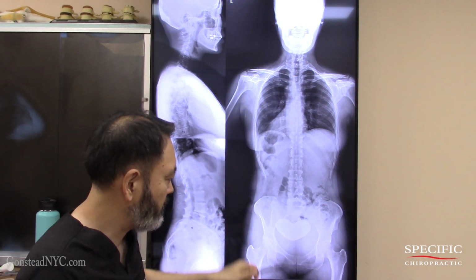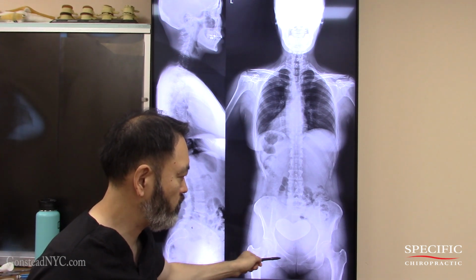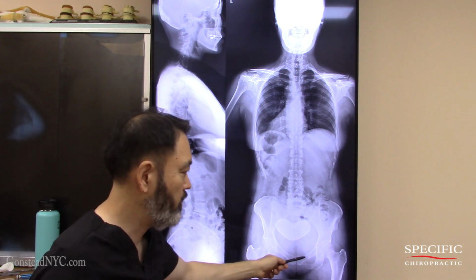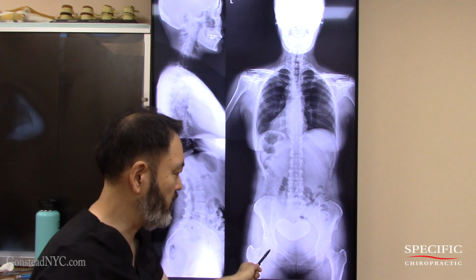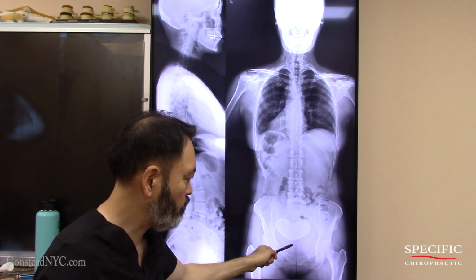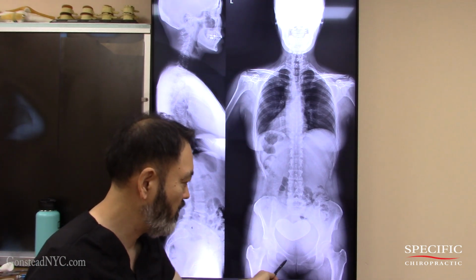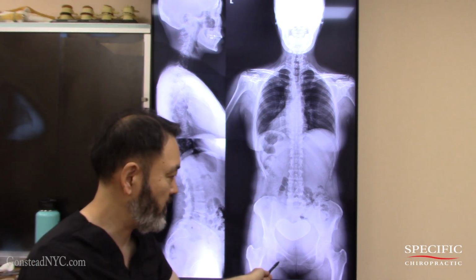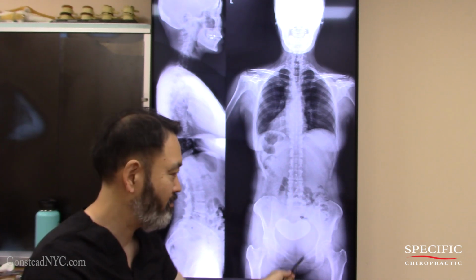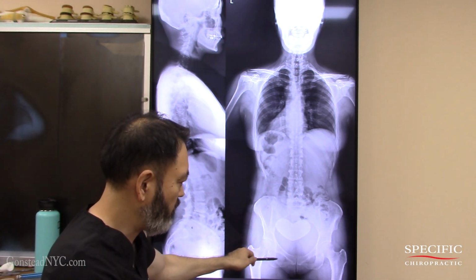Taking a look at the bottom part, if we look at the obturator foramen shadows, this is wider and this is narrow. So this got shorter, this got wider that way. EX, IN. The gluteal fold line to the left also confirms EX. This bony part over here will go wider, EX. This one, narrow, IN.